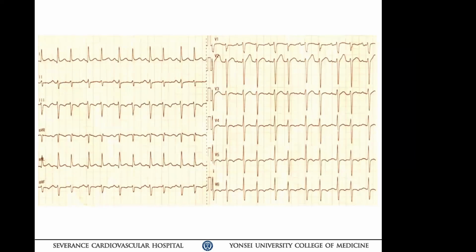Especially if you look at some noise in there. I agree, but then precordially, it certainly doesn't look normal. Terminal T wave, V3 for example, you got a T and then long, prolonged notching, much longer and wider than sinus P waves. So you wonder whether there's any retrograde activity going on from the VA conduction standpoint. So that's something that needs to be considered here.